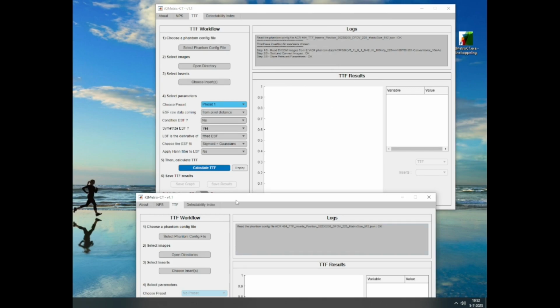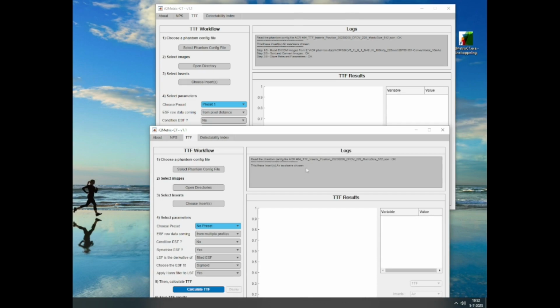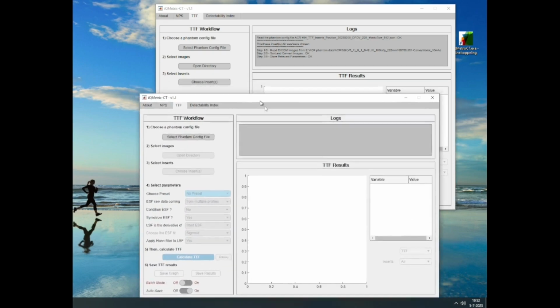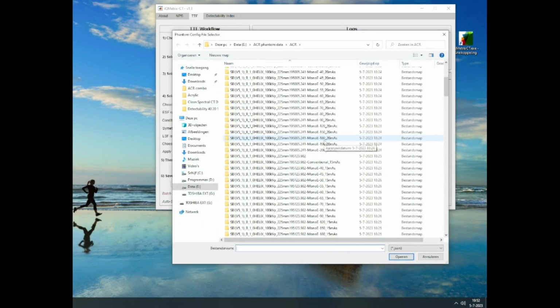Air was selected. Again here, choose insert. Air was selected. Air was chosen. Wait, batch mode should be off. That's my bad. Alright. Let us see which one that was. Let's do it again.